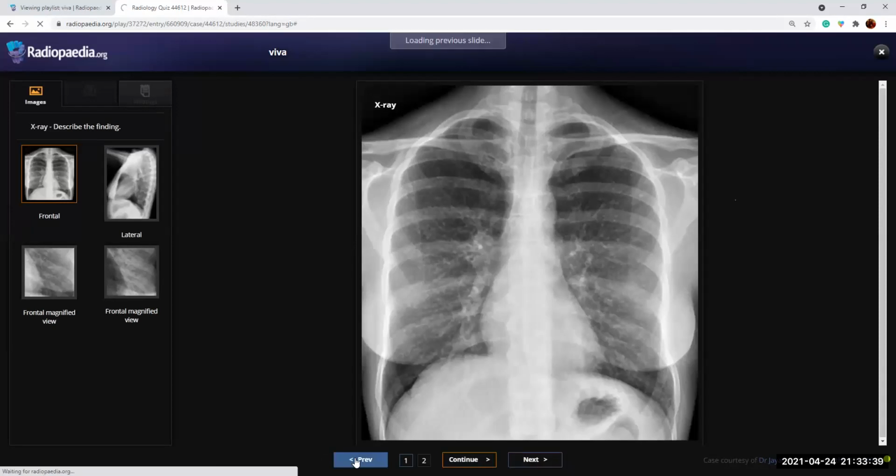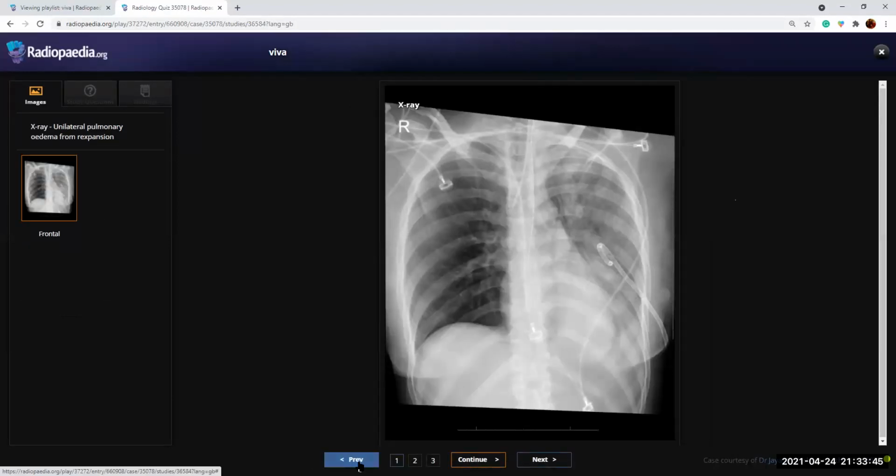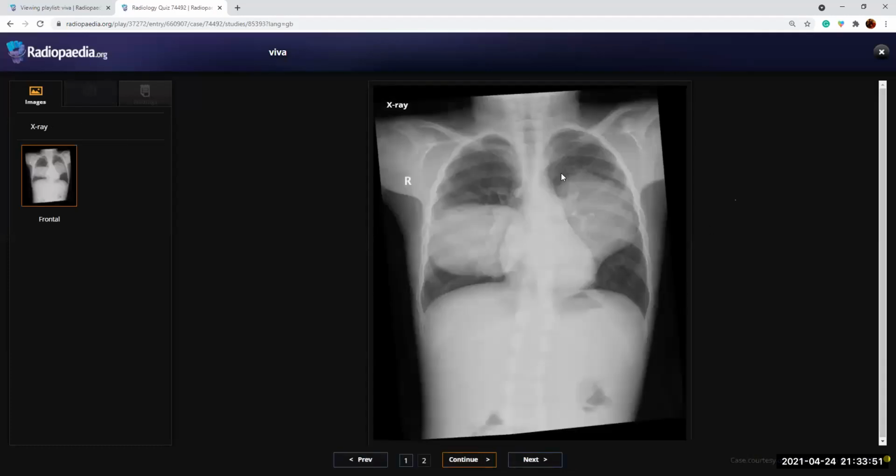The other one was pulmonary, moving slowly. The first one was hydatid cysts, and there are only these pulmonary lesions. You can see multiple and still see them so large. If you see such large lesions in the lungs, we have to keep that in mind, and they actually have low density contents, that's why we are seeing through them. Rest everything you handled well.